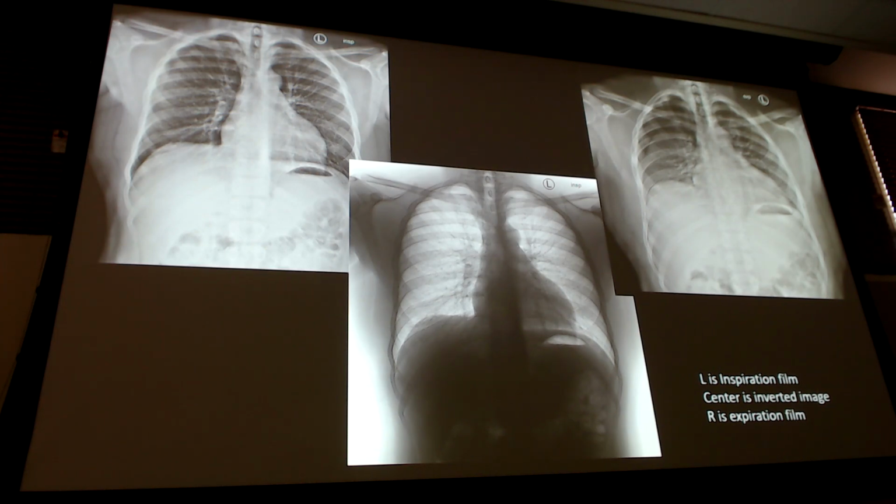Oh, you said tension, though. Oh, I'm sorry, I meant pneumo. Okay, yes, there's a pneumo. It's not tension. Yeah, sorry. That's okay. Yes, there is that same pneumo, right? It's right here, just inverted. So yes, there's a pneumothorax. It's not tension. Okay. So yes, you see the pneumo. That's good. There is one there.